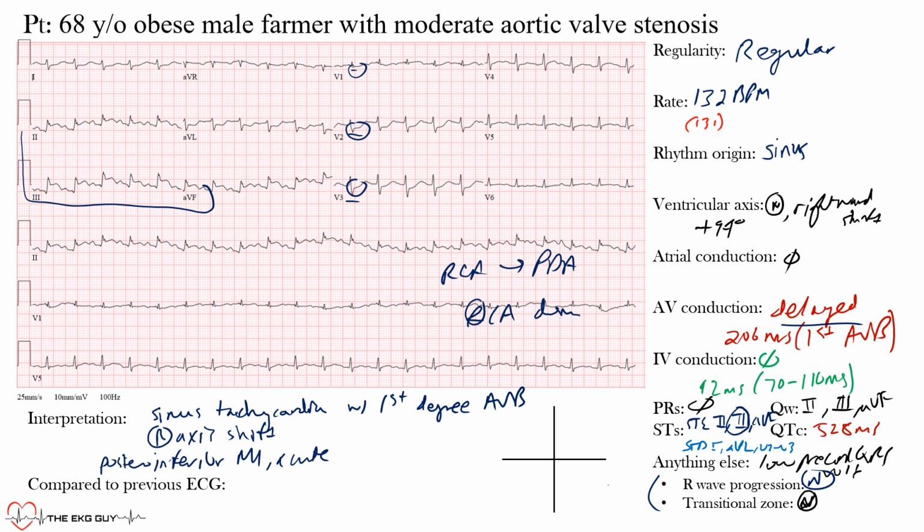The patient may be right-sided dominant because you see the posterior descending artery involved, which is supplied by the RCA in the right dominant patients, and a little more advanced stuff, but that's kind of what we're getting from all this. The other thing is the low QRS voltage, okay, specifically in the precordial. We said that it didn't meet it there in the limb leads.